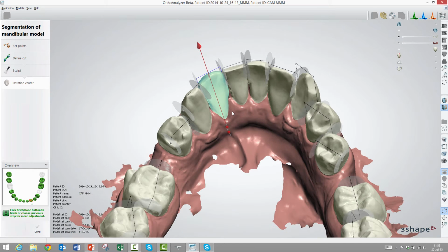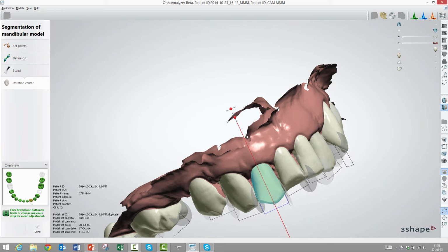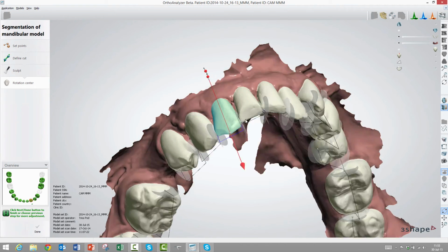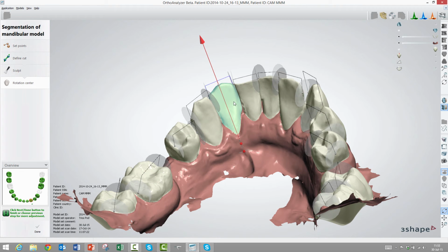In this part, we'll go in and set the tooth axis in the right direction. I guess this view is where, if you had a CBCT overlay, that would help you adjust the long axis. Exactly. And this point up here is the rotation center of the tooth, so you go in and set it exactly where you want the rotation center. Very, very important. You can also make these kind of alterations, and you can use the arrows again on the keyboard to jump between the teeth.